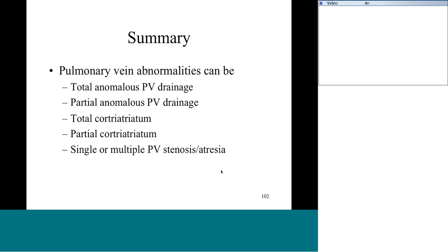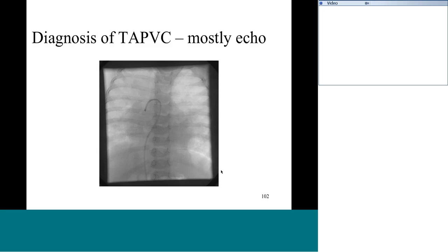It has got an altered pulmonary venous architecture. It has got a fir tree-like branching pattern, and it is notorious to be associated with right lung hypoplasia, abnormal vascularity to the right lung, sequestration of the right lung, sometimes severe disproportionate pulmonary hypertension, and that is a distinct entity. We diagnose TAPVCs mostly based on echo, but we need to understand not all TAPVCs can be identified just by echocardiogram itself.